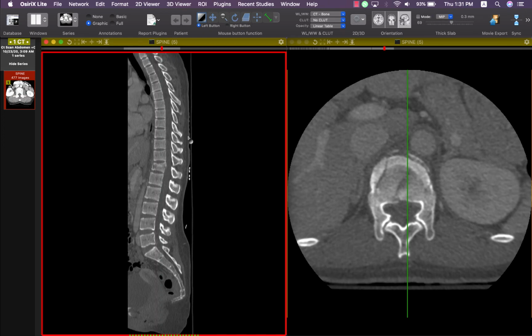Actually, many radiologists, if they see this fracture, call it a wedge fracture or compression fracture, and this is not correct. And this is the importance of the scheme. If you follow the scheme properly, we can reach the correct diagnosis. This is the affection of the posterior cortex, and there is even a small retropulsion of the superior vertebral endplate posteriorly. And again, this is one of the criteria of the burst fracture.